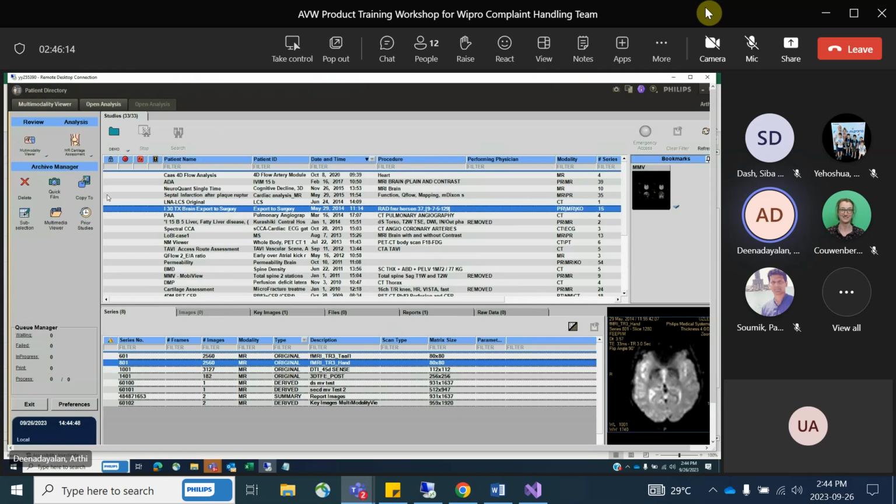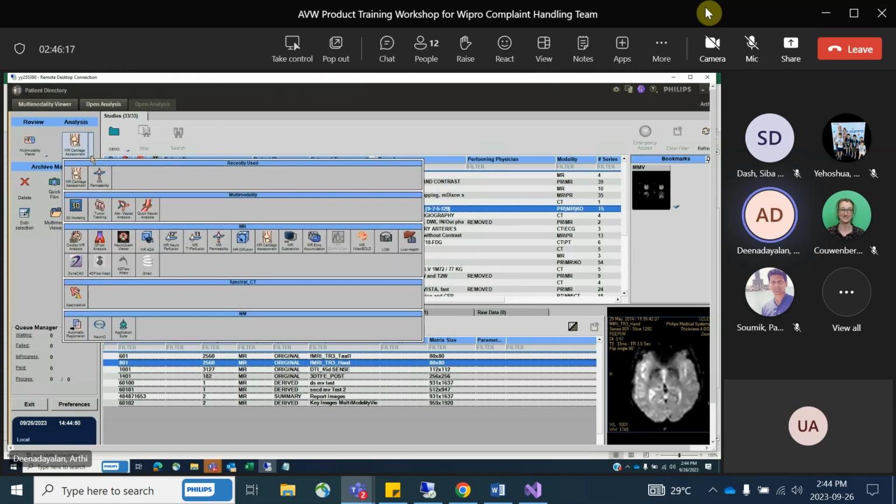First, maybe we will take the fMRI application. This is called MR iView Bold. It has another name, MR Brain Function, or fMRI application. fMRI is nothing but a functional MRI scan. So this generally stands for loading your brain scan studies into this application. I will tell you the basic functionalities after loading it, and first I will tell you how to recognize the series in the study for this application.